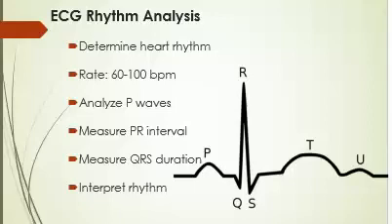So I'm going to try to talk a little bit slower so you will be able to take notes and write all this good information down. You want to measure your PR interval, because remember, if your PR interval is greater than 0.20, there is some kind of delay in the conduction or communication between the atria and ventricles, and that just doesn't even sound right, okay?